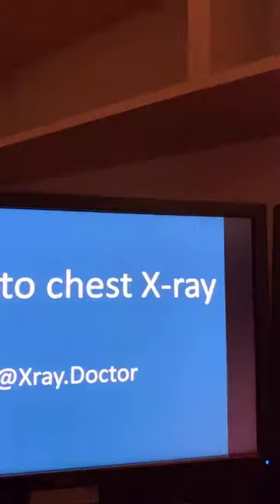We're ready to move on. We're gonna take everything that we just learned, all the normal lines, angles, everything, and apply it now to the cases that I have prepared for you guys. All right? Here we go, let's flip that around.